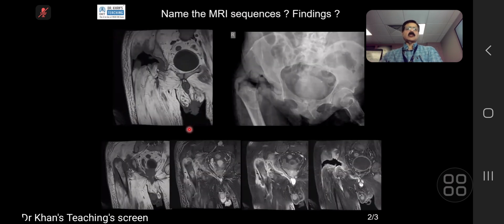Now on this MRI scan, we can see this is a T1, this is a STIR, this is post-contrast. And we can see the same findings. The air, of course, is low signal on this post-contrast as well as pre. On post-contrast, we can see this enhancing phlegmon. And here, of course, there is no fluid, there is air, which is surrounding high signal or enhancement. But the key finding in this case was that there was air here, and there should not have been any air here. Well done.